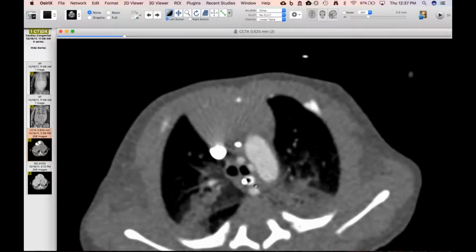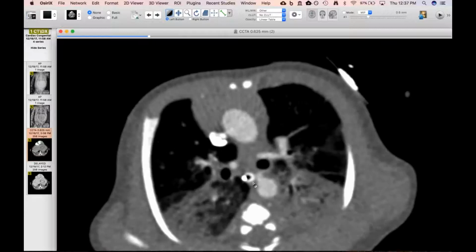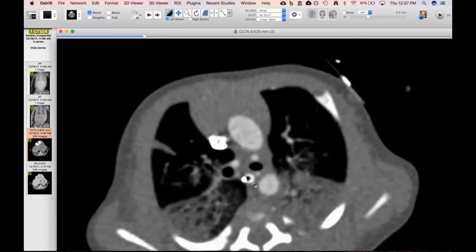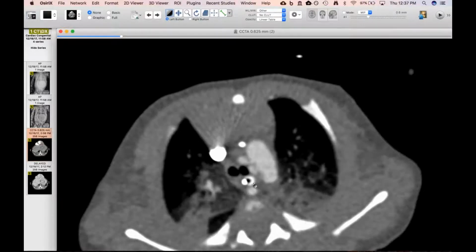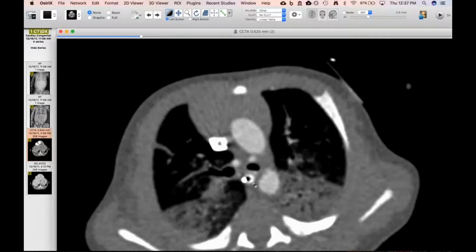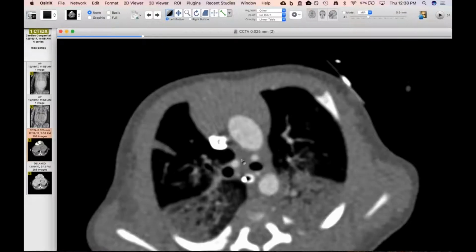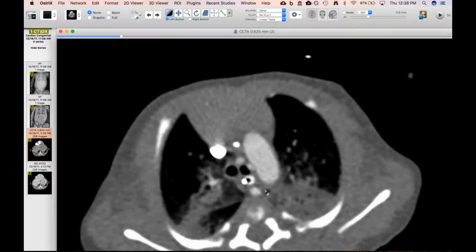Travis, I wouldn't call it a truncus because the branches to the pulmonary arteries aren't coming off a conal structure. Yeah. They're coming off the arch, so that would be presumably the fourth primitive aortic arch. Yeah. Different structure from the conus. So I think the truncus forms because of the failure of the spiral septum to form normally. Yeah. I mean, they have the classification, the different types of truncus, where some of them come off the aorta, but again, it's really more of an academic point, but it's very interesting.